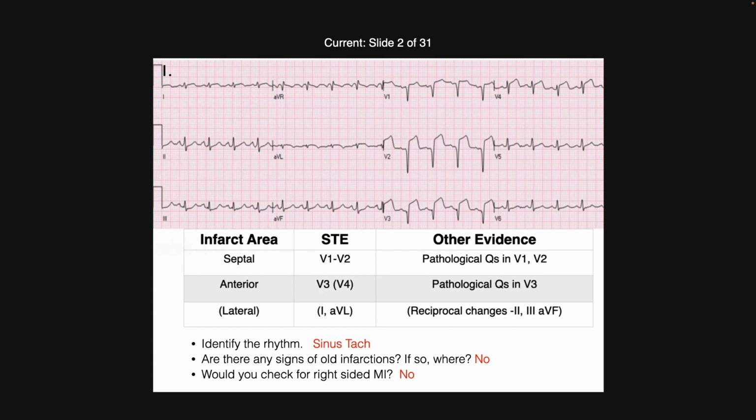The problem with relying on one box of ST elevation is that's the standard. But when you have a QRS that's like 3 boxes, it has to be proportional. And there's also a few other things that we haven't talked about yet that I see in one and aVL, sort of the shape of this is just very suspicious.